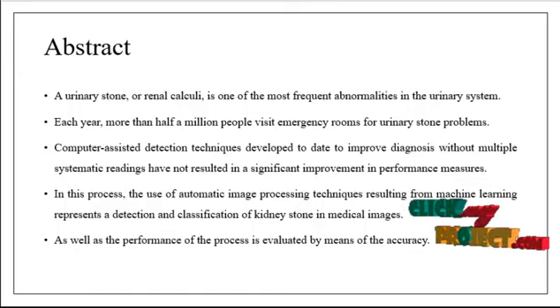In case a urinary stone has occurred, a pop-up message will be displayed as unhealthy image. Or else, if the input image is of a patient who is normal, without kidney stones, it will display the pop-up as normal.